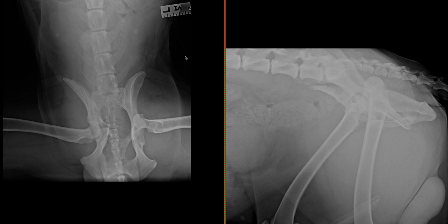The axial displacement of the right hemipelvis should be considered with great care, as fragments can compromise the rectal wall or the intrapelvic segment of the urethra.